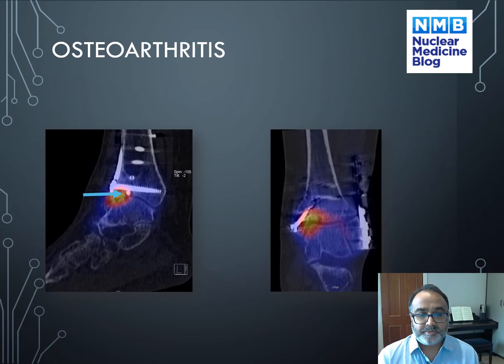So this is an example of a patient who's had previous internal fixation of an ankle fracture, but unfortunately the screw has eroded through into the joint itself, and we now have significant post-traumatic osteoarthritis. So osteoarthritis in the ankle is rare. It's not common as a primary pathology as in the hips or the knees. However, following injury, it is a relatively common complication in the long term.